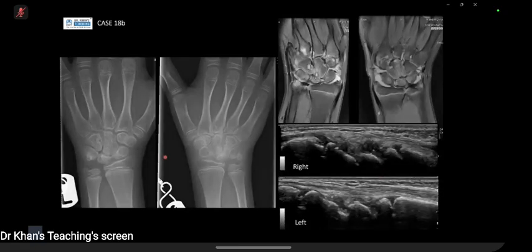On the other X-rays, what you can see here, nicely picked up, is that, I guess it takes time to get your eye in, but if you look at quite a few wrist X-rays of the same age, you notice that there will be a bit more joint space between the proximal carpal row. Distal carpal row still looks okay. This is the mid carpal row. The space is quite narrowed. It's called a bit of carpal crowding. There's also sclerosis. It just doesn't look very happy in the proximal carpal row.